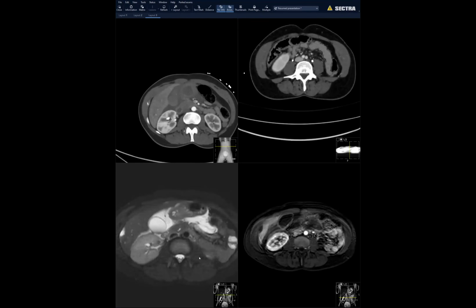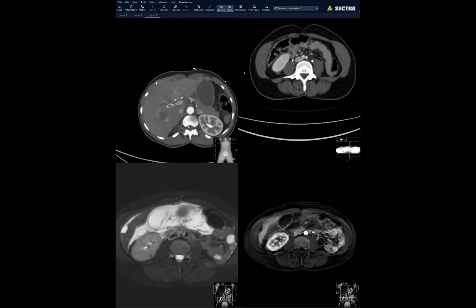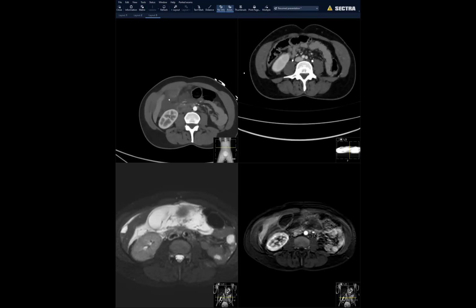Great call. That's amazing. I've never seen a traumatic gallbladder rupture. Right. So this was all blunt injury. I think it was some kind of domestic altercation. She got kicked in the abdomen. Oh my gosh. All this from blunt trauma from an assault. So it's very sad. But she's doing well post cholecystectomy and repair. They fulgurated the liver and they did a cholecystectomy. So serial scans, I think, really help. Despite not having Eovist, retrospectively, somehow the CT also helped us put two and two together.